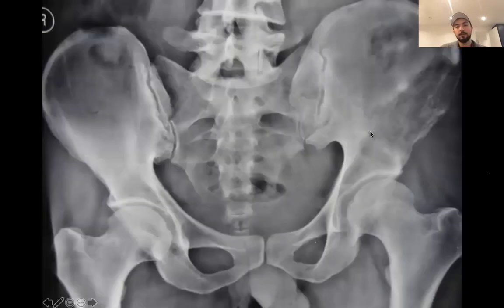Here as well, you can see some dark spots across the pelvic bone. And this is caused again by bone cancer, but this time the cancer is actually eating the bone away. This is called lytic bone lesions or lytic metastasis. As you know, lysis is breakdown. That's why they're called lytic. So as you can see, this is an obvious sign of bone cancer.